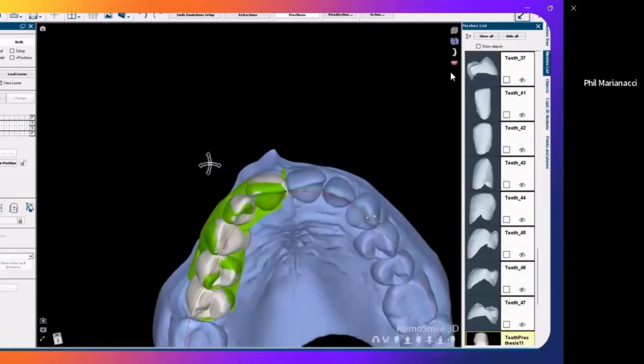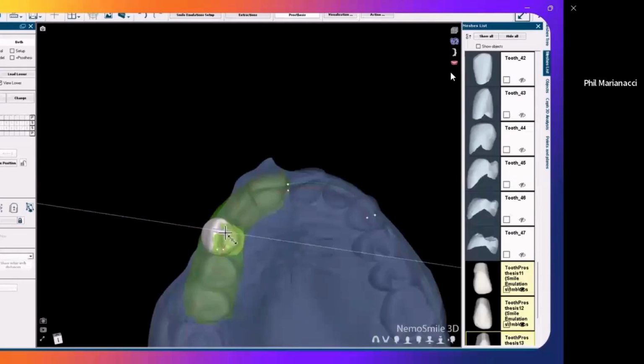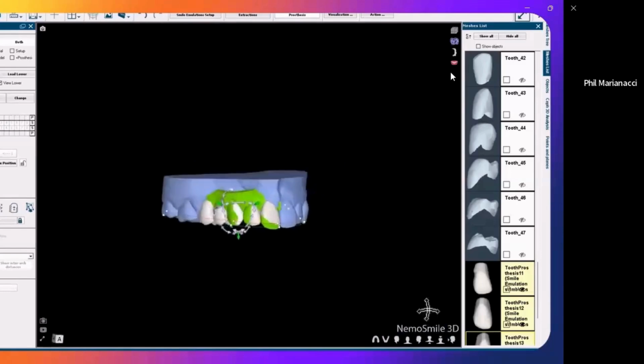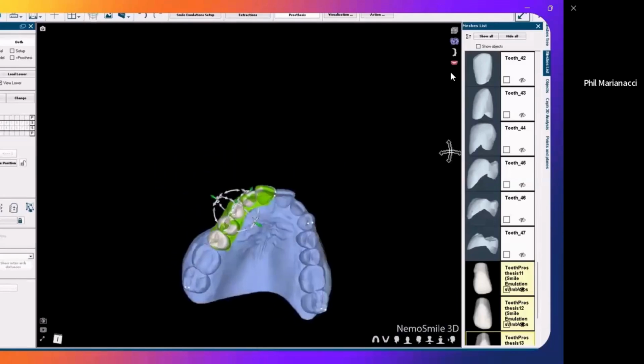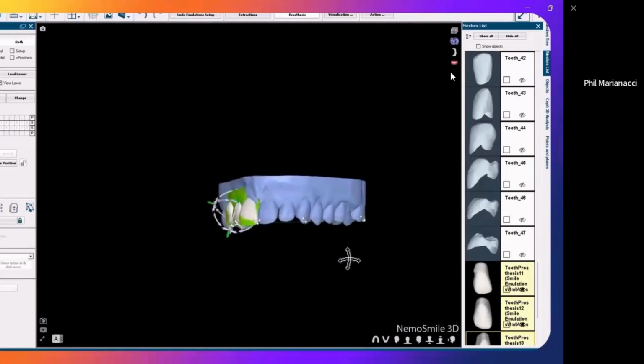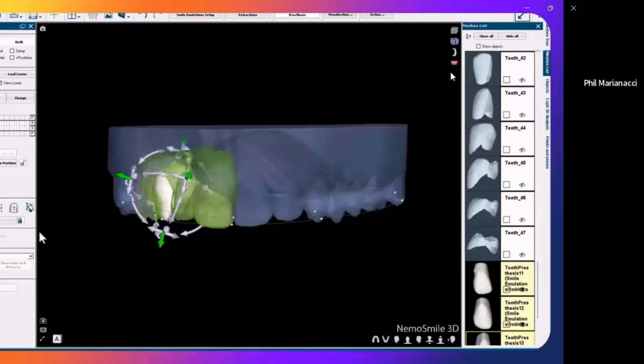And we've got this. And again, from a surgeon standpoint, we're just trying to get a sense for where we need to be. Many people would just go ahead and use a dental laboratory to do this portion of it for you. And now we've got a sense of a prosthetic guideline.